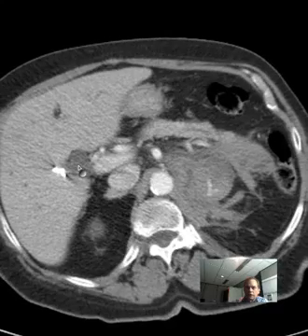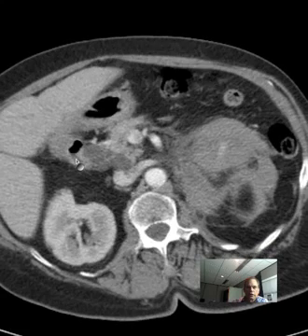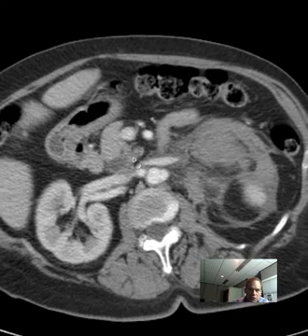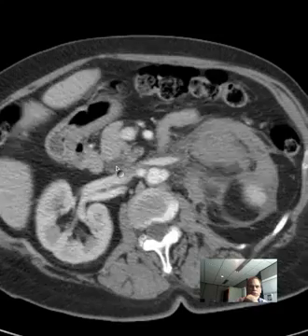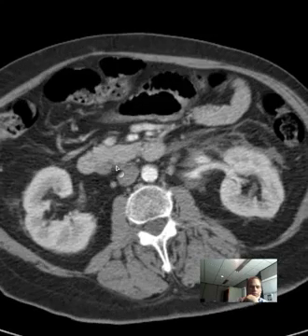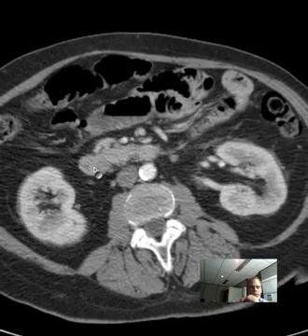A patient had the gallbladder out, and here you can see the common bile duct going toward the pancreas through the head of the pancreas, which is not real well demonstrated here, but this is the head of the pancreas here. And the distal common bile duct should be emptying out into the duodenum, which is right here.